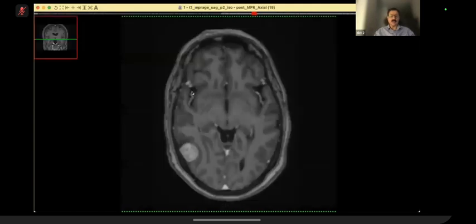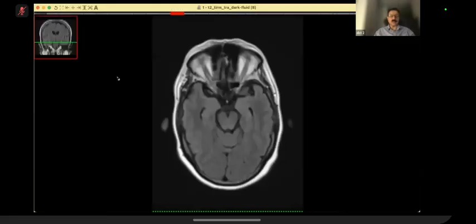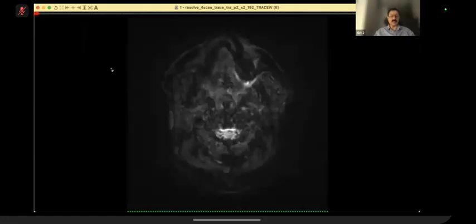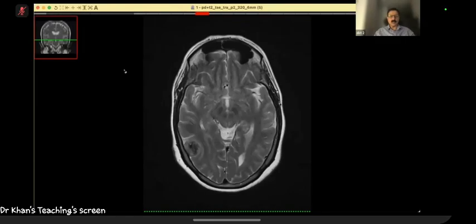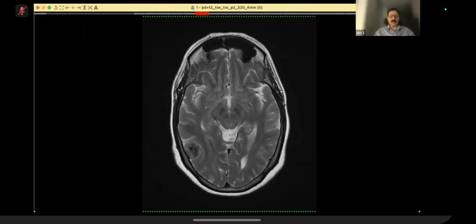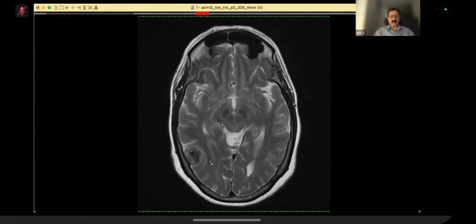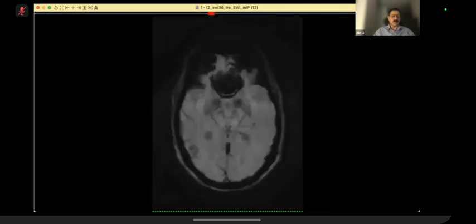Otherwise, you did well. Basically, that calcification, if you saw a FLAIR sequence, was not very helpful. Now this is the T2 weighted sequence. On T2, of course, just on an axial, it becomes very difficult to comment if it is intra-axial or extra-axial. But at places one can see a bit of a cleft there, but just on axial, it will always be very difficult.